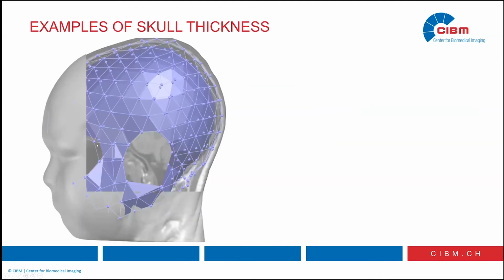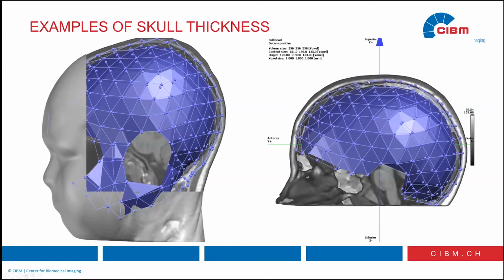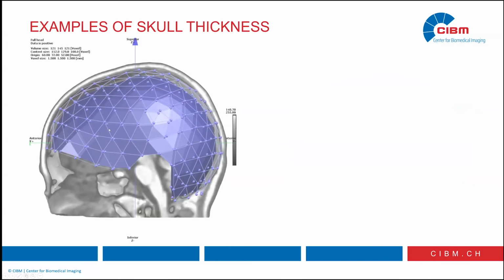That's a patient or subject. No, that's a patient. How it detects another patient showing the inner and outer skull detection. On the left, that's a teenager, so the skull is a bit different.